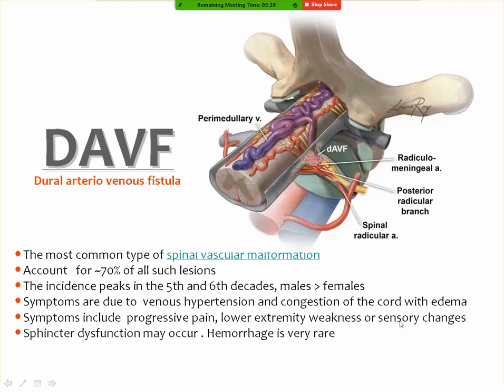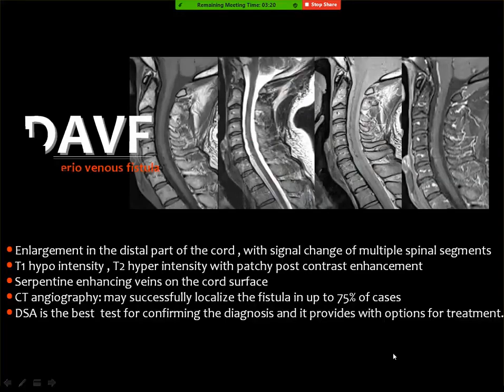And this dural arteriovenous fistula is commonly missed in clinical practice because if you look here and you can see some vessels, you say these may be the normal epidural vessels or artifacts or whatsoever.